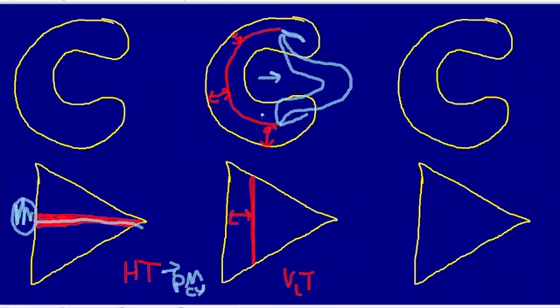So when this segment gets pulled inward, it takes on the appearance of what's described as a handle, where the remainder of the meniscus is described as a bucket. You could kind of imagine putting your hand underneath this handle and basically carrying the meniscus, which is the bucket. So be aware that the complication of a vertical tear, if it goes unchecked and the right amount of force occurs, is a bucket handle tear. So I'll write that in right here.